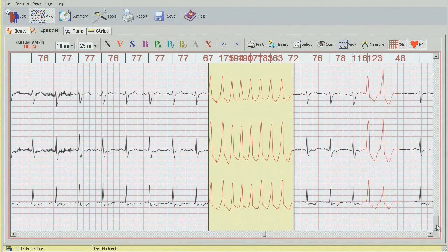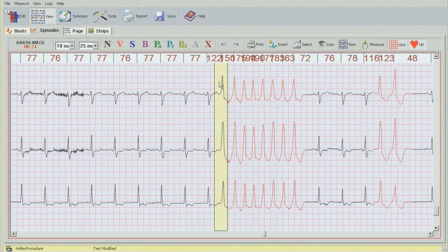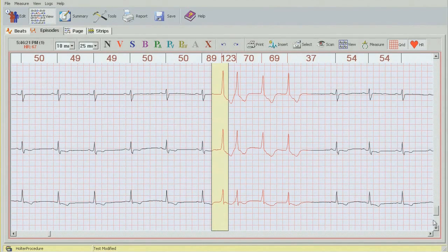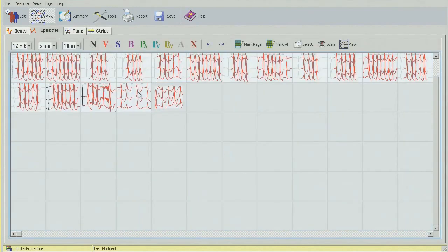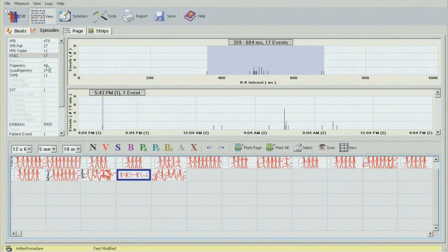And they all seem to be fine, actually the first one is missing a first beat here. You can see there is no bar. So I'm going to insert this and change to ventricular. And check the rest of it, and it seems to be fine. So again, Z button to go out of there.